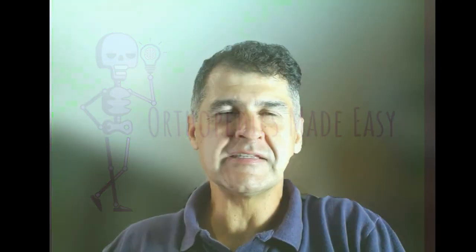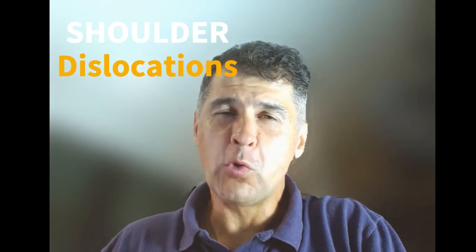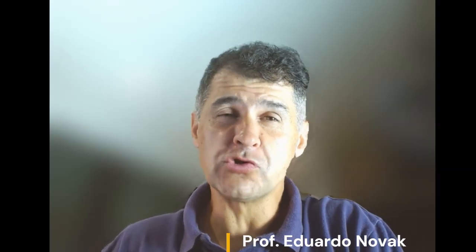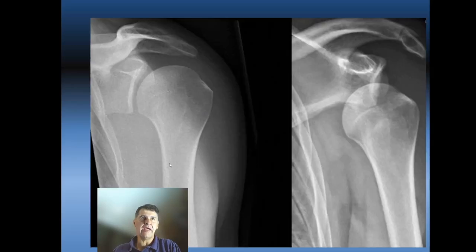Today we're tackling an essential topic for any healthcare professional dealing with trauma: shoulder dislocations. We walk through the key bone landmarks you should focus on in three different radiographic views: AP, axillary, and lateral or scapular Y, and compare what you see in a normal shoulder versus anterior and posterior dislocations. Let's dive right in. Let's learn how to assess X-rays.